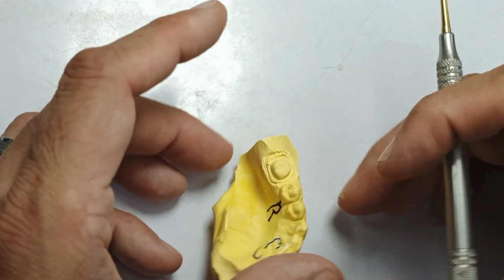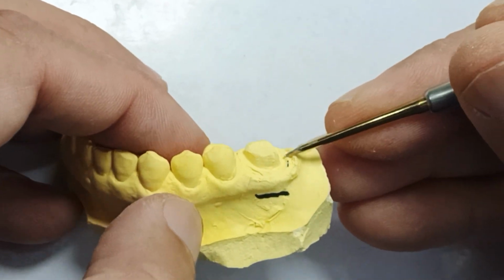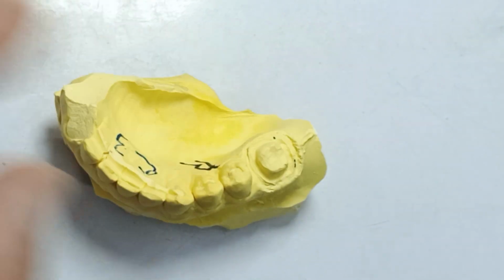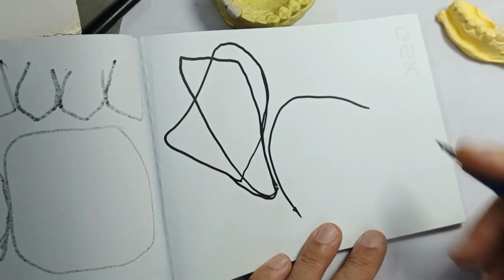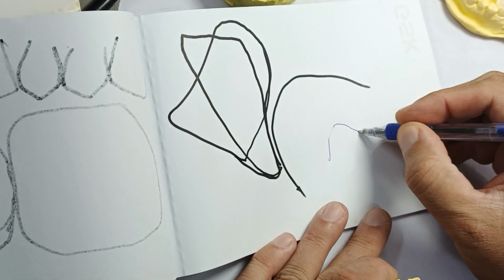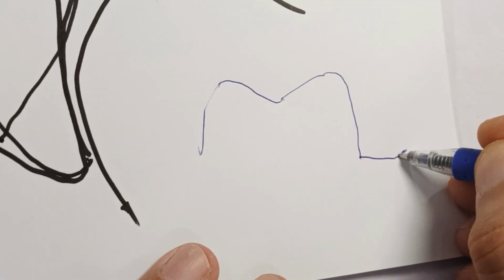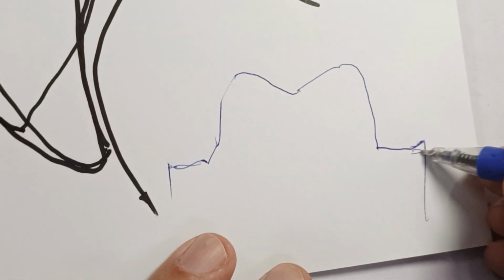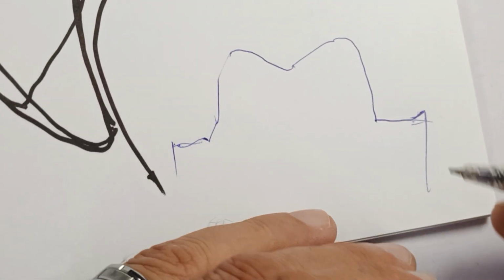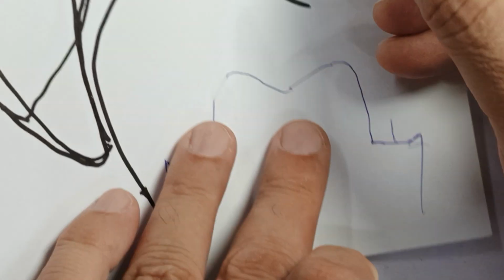Now this prep. It is prepped all around. You can barely read the margins, but here is a problem. You have a ledge right there. I'll explain to you what a ledge is. In this margin right here, if you take a look, get closer please. The margins are very wide and they are lifted at the end. This is unsupported. You can't have a ledge right there. It is supposed to be smooth, and the margin is supposed to be, I'll draw another one here.